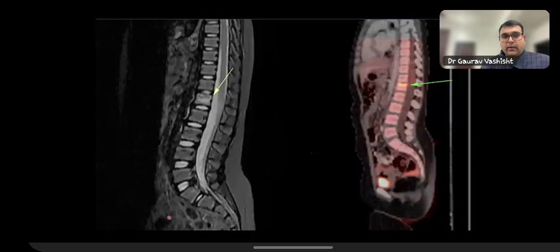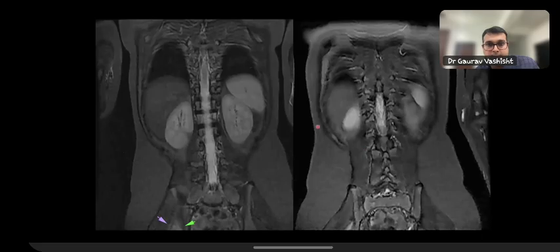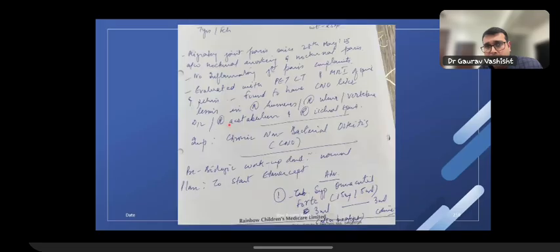And this patient had come again for an opinion. So they had a PET CT available, which showed the tracer uptake along the end plate, as well as in the right acetabulum. And the SI joints were normal in this case. Rest of the bones were fine. The right-sided acetabulum showed some marrow edema, and these were corresponding PET images which we could see. And yes, there was some tracer as well in the distal radius and ulna on the right side. It wasn't there on the left.